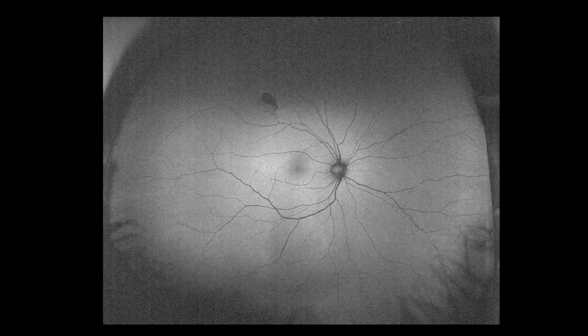Here's a patient of mine, it's actually a resident, who showed a lesion. On the last day of her residency program, she asked me to take a look at it. She wouldn't let me dilate her. She said, why don't you take a look and do an Optos, and you can get a cross-section with OCT, that's okay. Tell me what I have. In any case, it did show up on autofluorescence. And we know that CHRPE lesions do show up on autofluorescence. So it could be a CHRPE lesion.